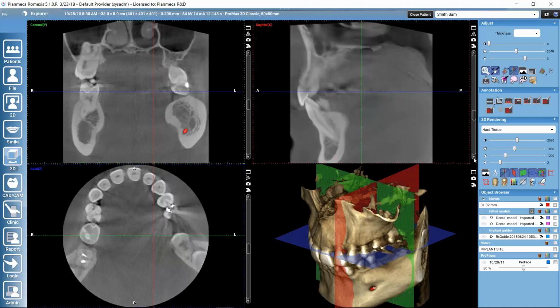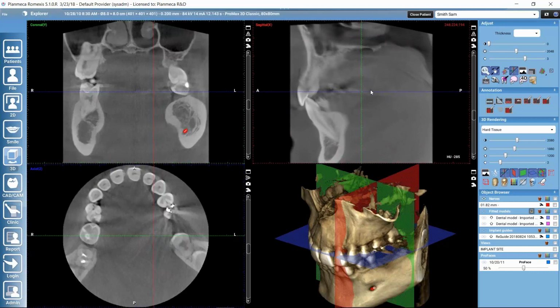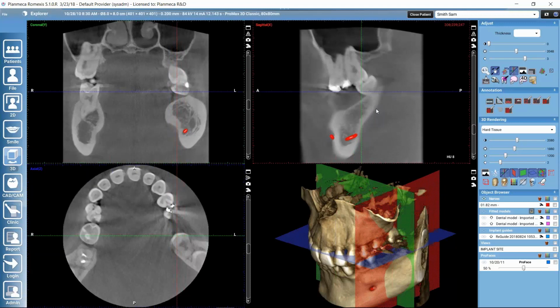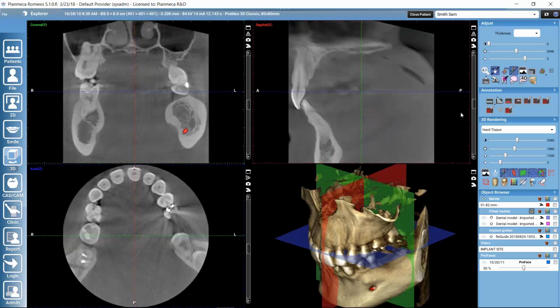accurately the volume. And then here, considering the navigation into data, here we have 2 functions that are essential in the navigation. So firstly, when this first one, zooming, is active, we can use our mouse wheel on top of any of these views, and we can zoom in and out the view. But instead, when we deactivate this toggle zoom here, and now we use our mouse wheel on top of the view, we see that we can actually navigate through the data, just like we did with the slider.